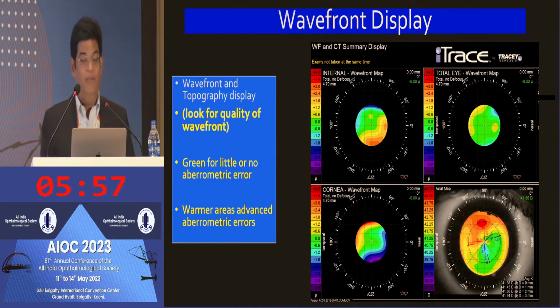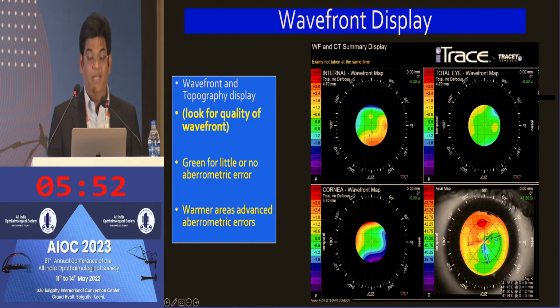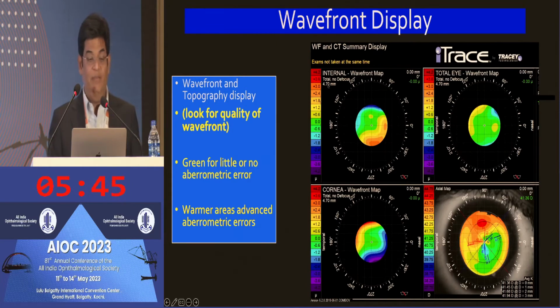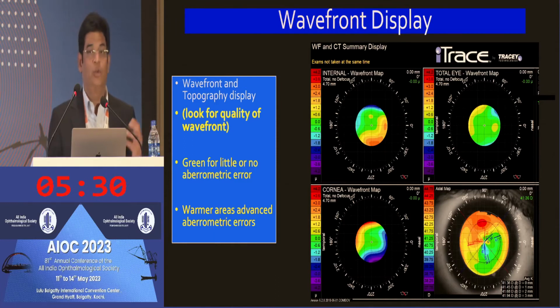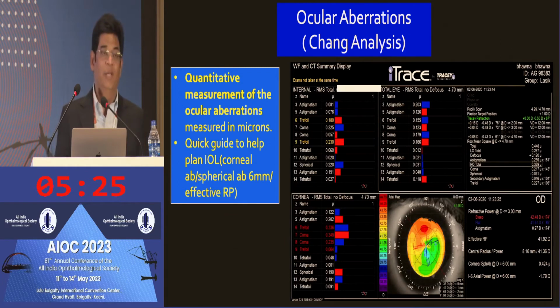Now we have the wavefront display map. Just look at this map of a girl who had come for refractive surgery. By internal, we mean these aberrations are limited to the lens or the lenticular system of the eye. A green, even color is considered normal. If we see anything else that is variegated in appearance, with multicolors, rainbow colors, something is very wrong with the eye.